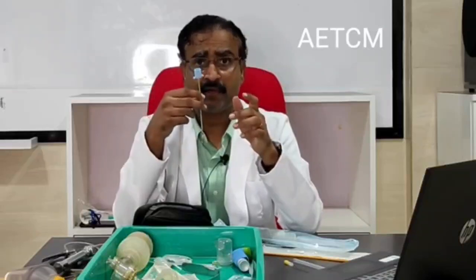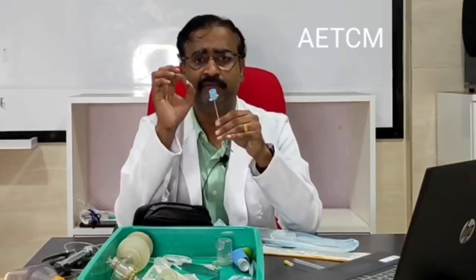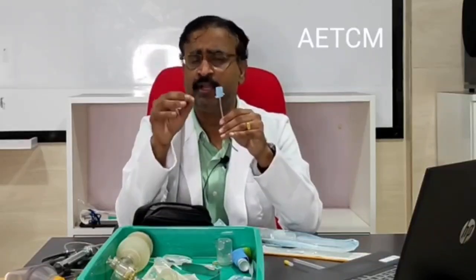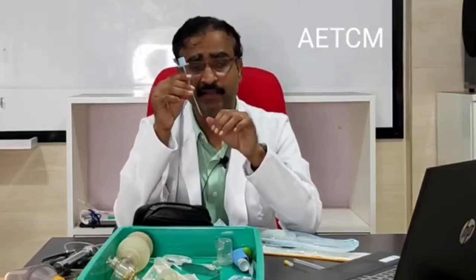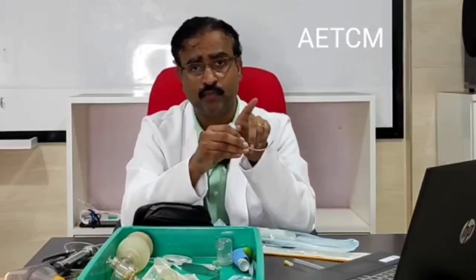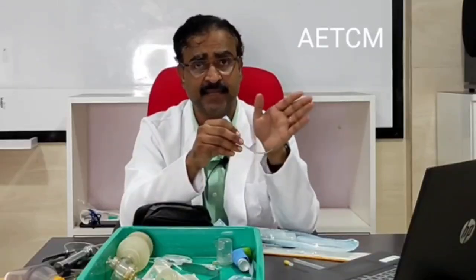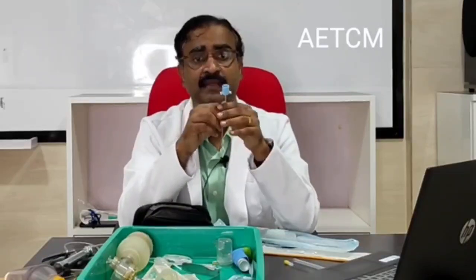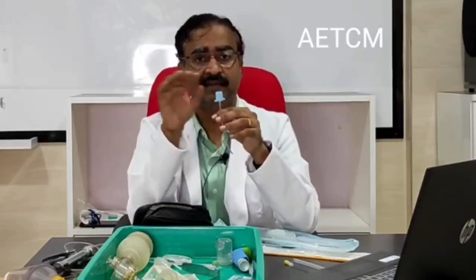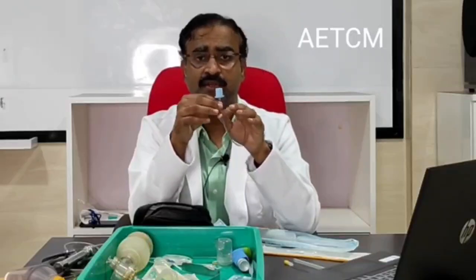And if you are inside the trachea, when you auscultate both sides of the hemithorax, you should be able to hear very good air entry. If you are not able to hear it, then there is a problem. If you are able to hear it only on one lung, on one side of the chest, it means that you have intubated and gone through to one side of the lung, into one of the main bronchus, either the right main bronchus or the left main bronchus. You need to pull your tube back, okay? Pull your tube back till you hear the air auscultated well in both the hemithoraces. So this is how you actually know that you are in the correct space.